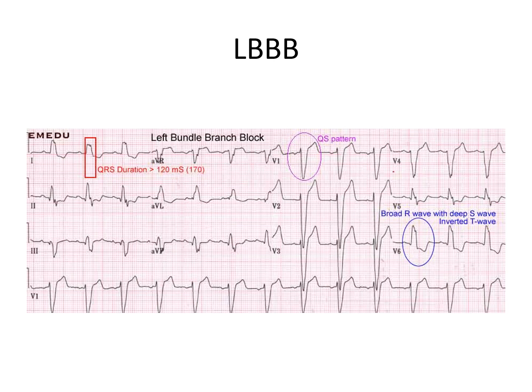Fourth, you will see, and this is best seen in lead 1 on this particular EKG, a little notch on the top. Well, that notch is the right ventricle depolarizing quickly with its functioning fascicle in the middle of the slowly depolarizing left ventricle that doesn't have a functioning fascicle. And because the right ventricle is depolarizing in the opposite direction to the left one, you'll see the superimposition of the RV on the LV, which will be represented as a little RSR prime pattern.